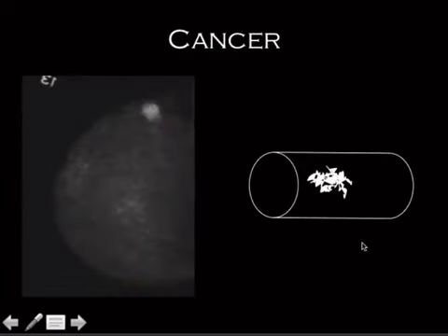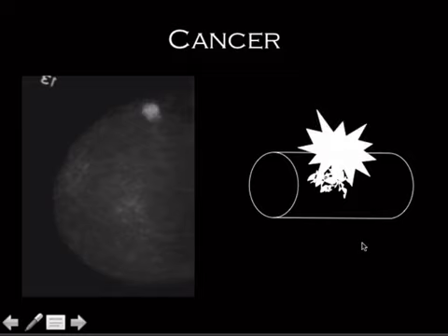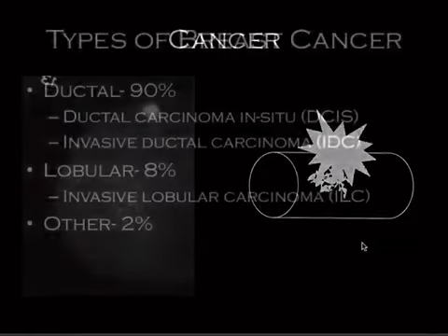So unlike DCIS, where the cancer is confined to the duct, we're dealing with a cancer that has broken through the duct. And on imaging, this usually looks like a high-density mass with indistinct or spiculated margins. It can have associated pleomorphic calcifications. And on ultrasound, we're going to have this anti-parallel shadowing mass with an echogenic halo. That's like the classic look.